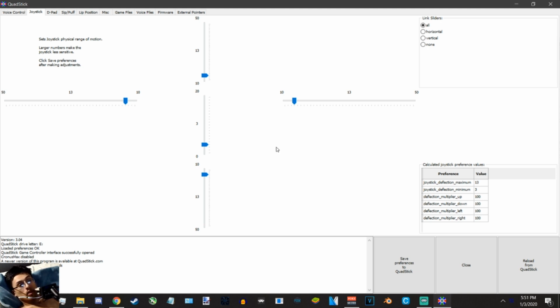That is my sweet spot because I am using the Quadstick FPS that has a more square build. There's older models with the circle ones, or even the original ones with the spring. So they may have different sensitivity options. You just gotta find the right one for you. The lower the number, the more sensitive it is. The higher the number, the less sensitive it is.